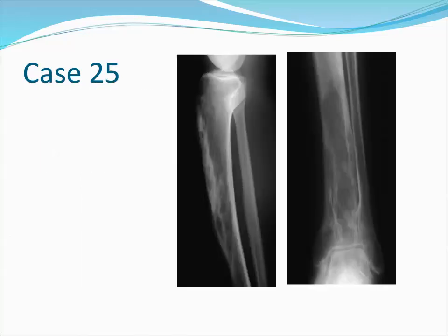Case number 25, Paget's disease. The lytic phase in two different patients. Relatively well-defined V or flame-shaped areas of deossification containing strands of increased bony densities in a slightly expanded shaft are characteristic, A, proximal tibia, B, distal tibia and fibula.